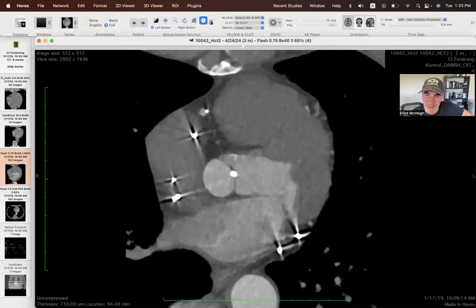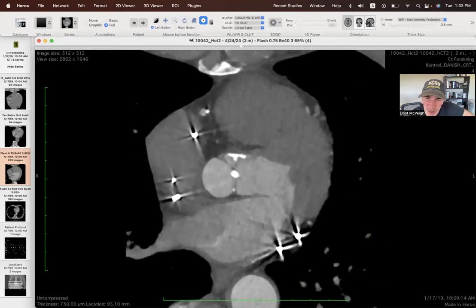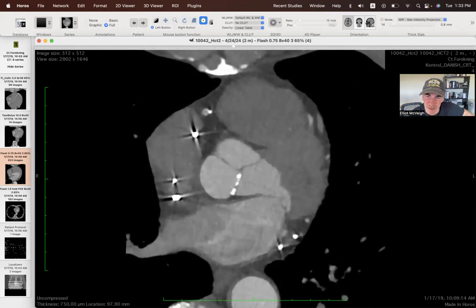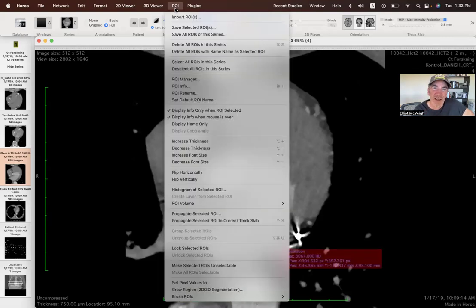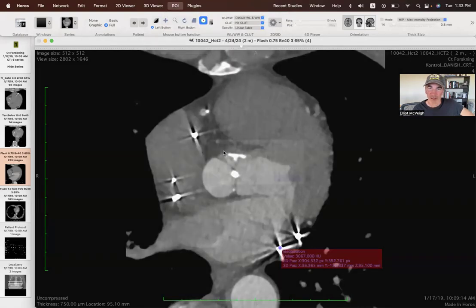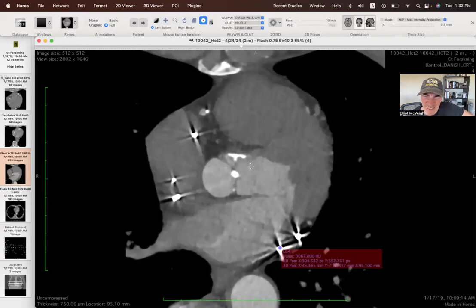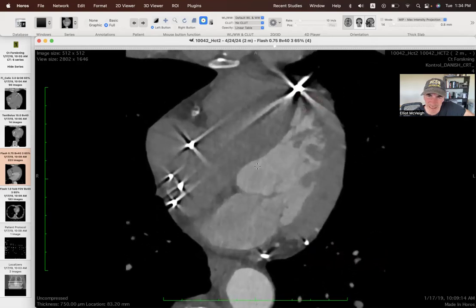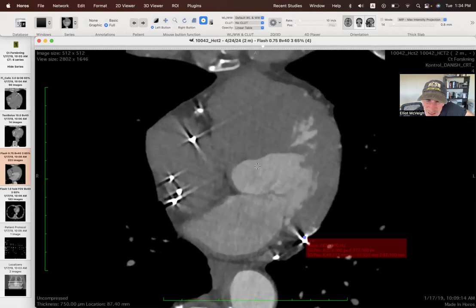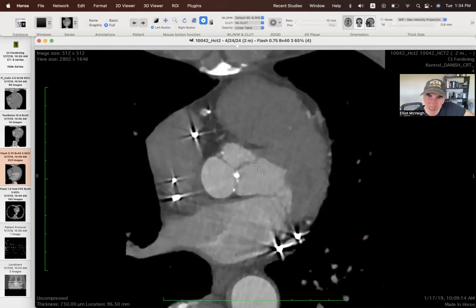All right, the next LL3, LL4 got deleted. When I deleted it, I deleted both of them. They're linked somehow. Huh. Okay, so I've got to put this one back. Click on it and call it LL4. Wow, this was exciting. That's LL2, LL4, LL3.